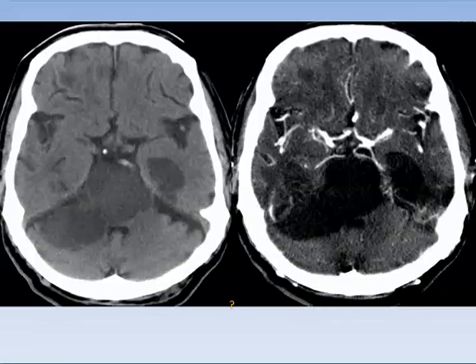The same here. On the left side is the CT non-contrast, on the right side is the CTA source image, and this is the source image. It delineates very well the ischemic infarct in the right cerebellum, brainstem, and left temporal region.